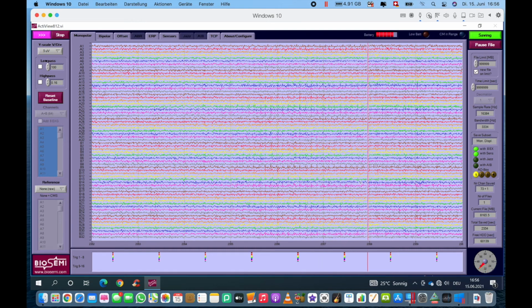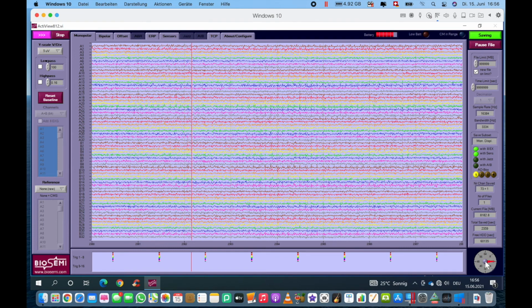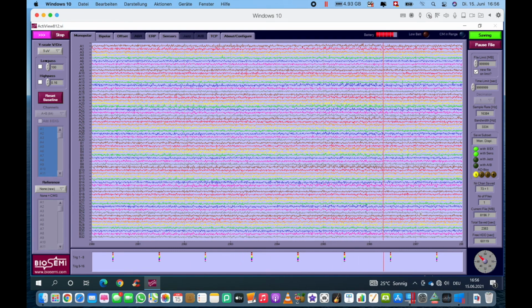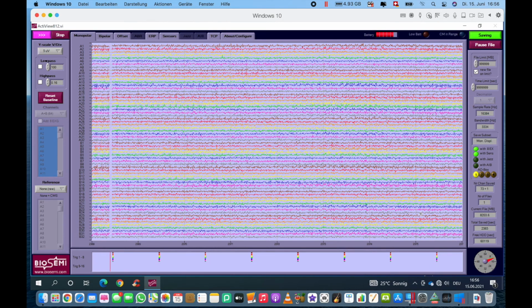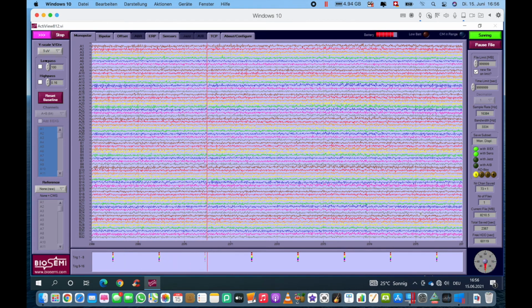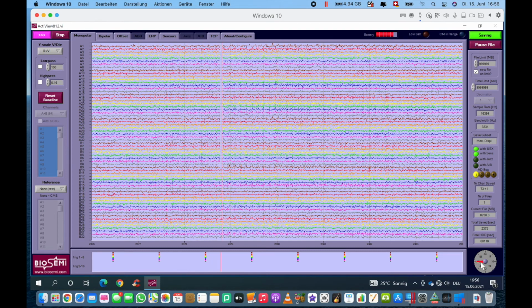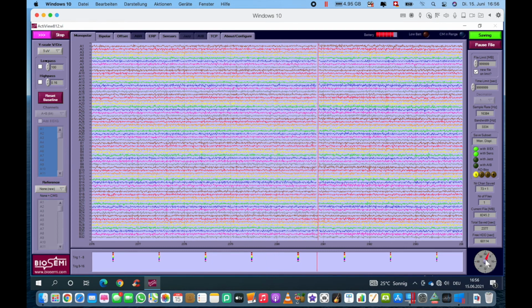Again, when you look at the little speed dial down here, this goes 4 times as fast as it would normally go on a normal Active 2, not running on high speed, basically running on 16 kilohertz, but not high speed enabled. So that's not speed mode 3, but speed mode 7, which would probably run 4 times slower than this.